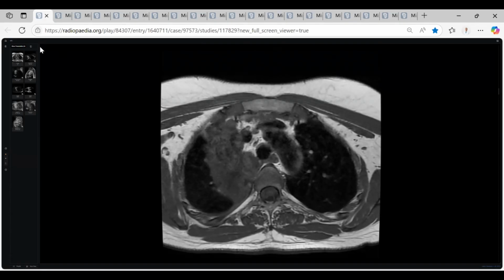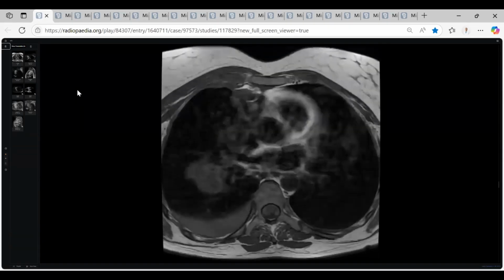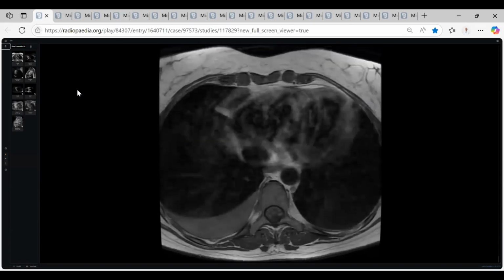Next candidate. Thank you, sir. Yes, this patient, a 50-year-old patient, presented with chest pain. Can you request the control? Okay, please, I requested the control. Is this patient 15 years old or 50 years old? 50, sorry. Request control, please. If you don't know, no problem. Go on. I don't know. Please, can you move it?